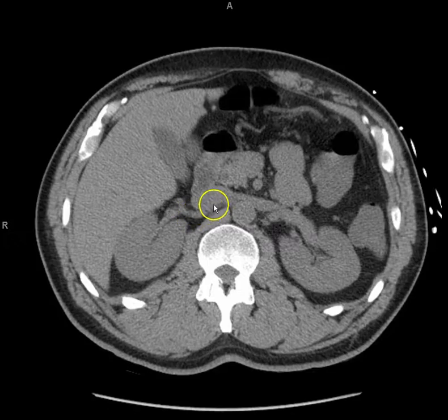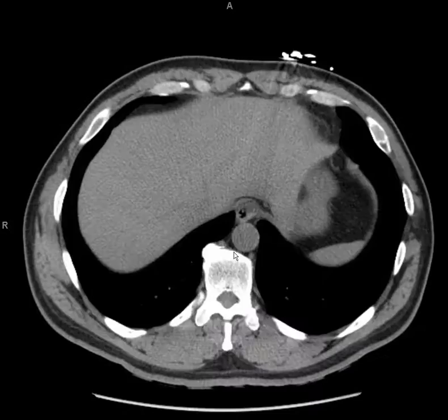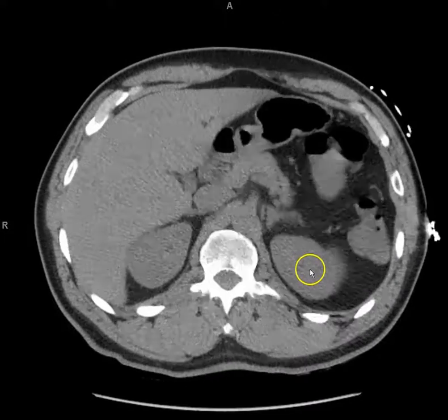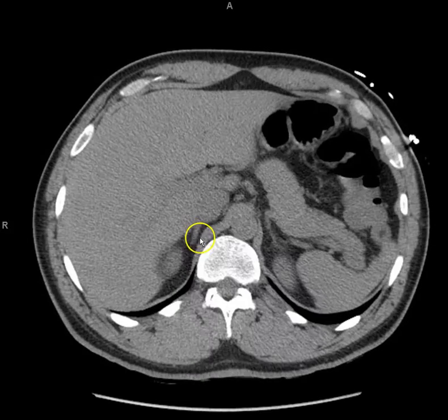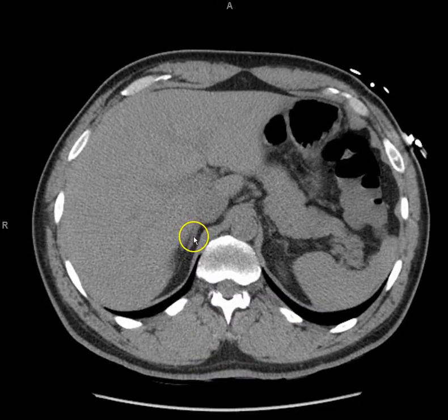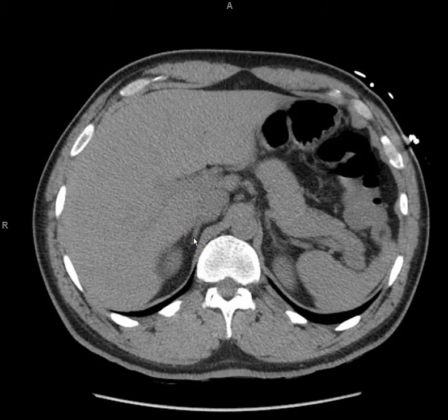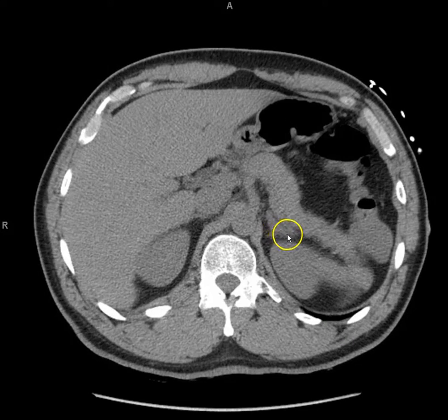And the right renal vein is very short. Okay, go back up. What is this structure here? And this one? Right. Good. If I come up here and I show you this sort of Y-shaped haziness in the fat next to the top of this kidney, what would you call that? Yes, that's the right adrenal gland. And you would have another one right over here. Sort of looks like an upside down Y.